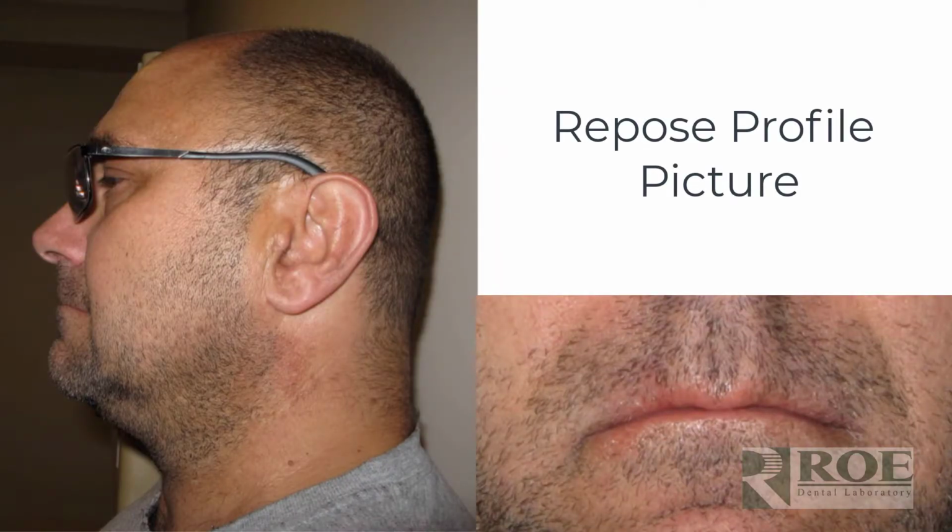In this particular case, this patient has a reverse smile, and that is an indication of a closed bite. I mean, there can indicate other things, of course, but generally a closed bite. Often you can see some soreness and redness around the commissures. But this is an indication, and it helps us decide with you, the doctor, how much to open the bite. And so we ask for a repose picture so we can have a discussion, so that we can analyze the records in a little bit different way maybe than other cases.